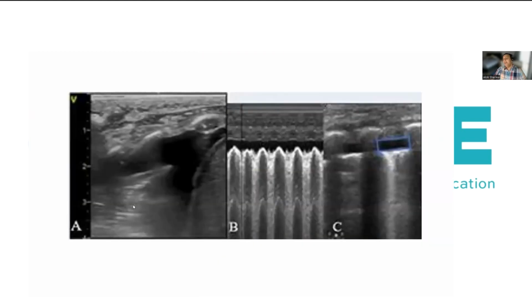Now, how do we diagnose a pleural effusion on lung ultrasound? Of all the pathologies that you identify when you're using lung ultrasound in neonatal practice, I think the diagnosis of pleural effusion is quite easy. The important thing from our perspective is being able to pattern recognize how it might look, but more importantly, to quantify exactly how large it might be, and where the pockets of collection are largest so that you're tapping in the right areas if you need to.